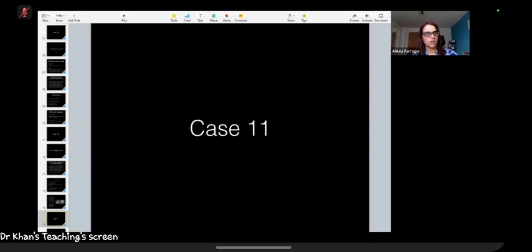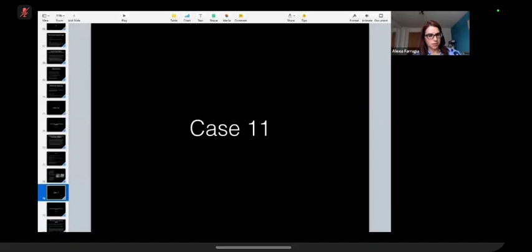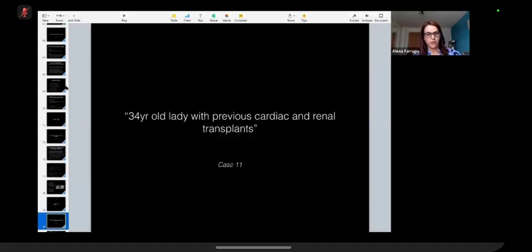Let's move on to case 11, which will be your last case. Okay, are you ready for this next case? Yeah. Case 11. This is your history: 34-year-old lady with previous cardiac and renal transplants.